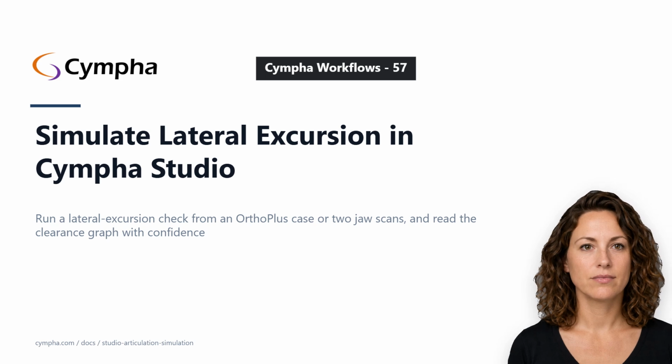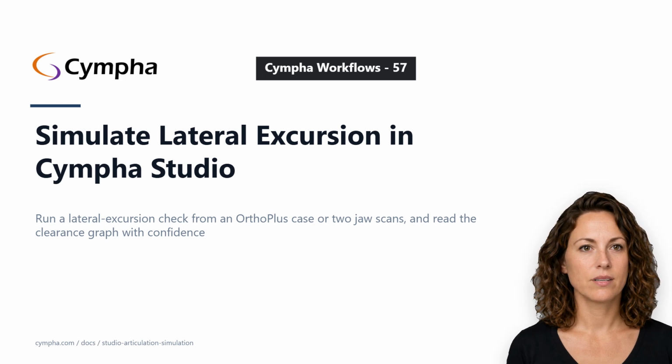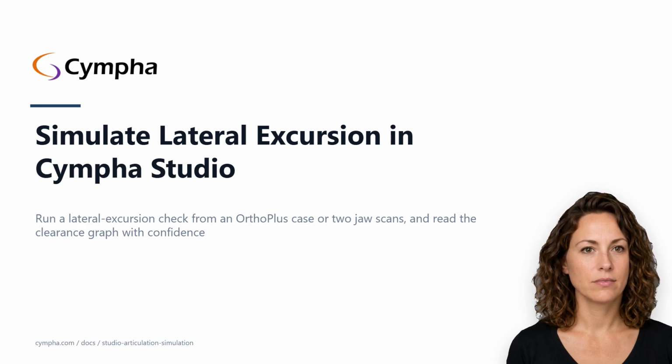Welcome to Guide Mia. Today we're going to talk about simulating lateral excursion in Cympha Studio. This is for orthodontists, prosthodontists, and lab designers who want a quick visual check of how the mandible moves laterally against the maxilla, for consult discussions, plan sanity checks, or occlusal clearance review.